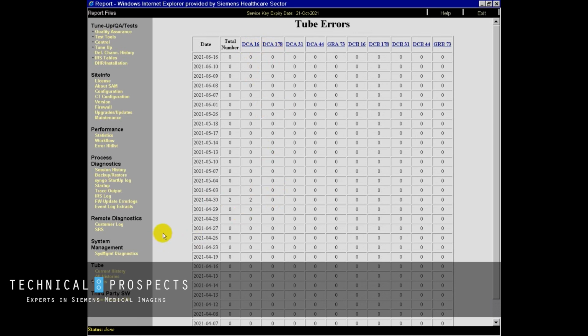So this is how you view your tube history in the service software.